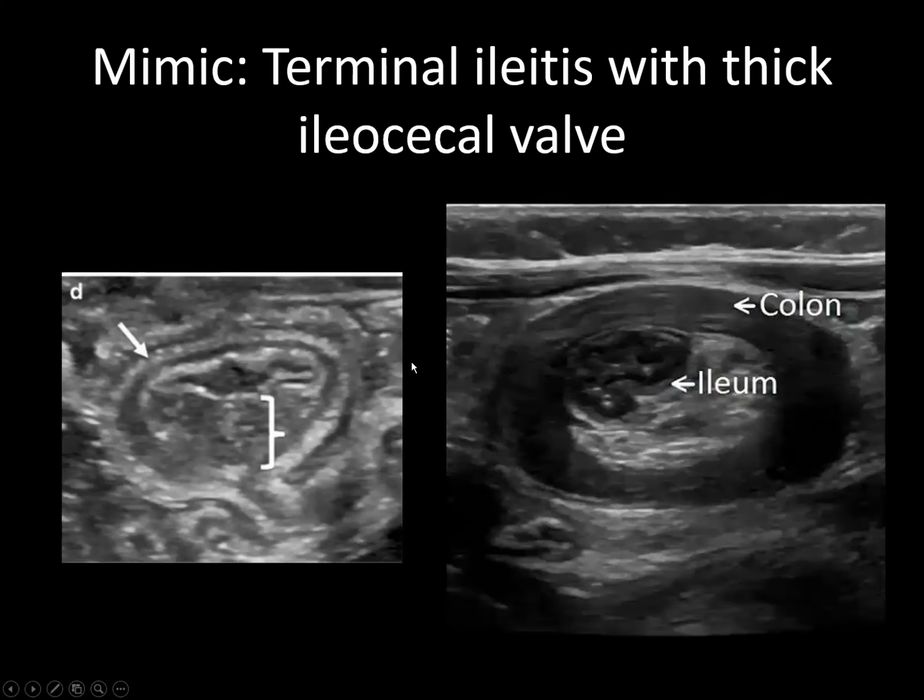And here's a side-by-side comparison of a true ileocolic intussusception. You actually have the ileum with its own gut signature, and then the cecum or colon as the outer wall. Again, really thick fat, just eyeballing this, maybe some mesenteric nodes scattered, but the fat is what matters most. That thickness, just eyeballing, is thicker than the outer wall. That clinches the ileocolic intussusception diagnosis. Whereas here, the example of the terminal ileitis with an edematous and thick ileocecal valve, no fat whatsoever within the lumen.